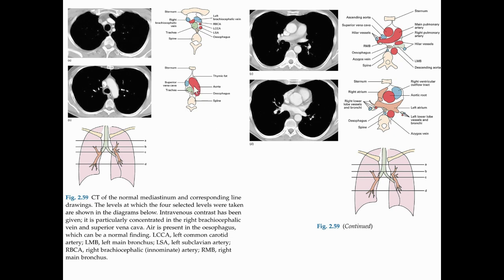Whatever is written here, like the aorta, this is the aortic arch, is actually this anatomical entity over here, and this bright white area which contains the iodine containing contrast media is the superior vena cava, because this patient probably received the IV contrast through his right arm.